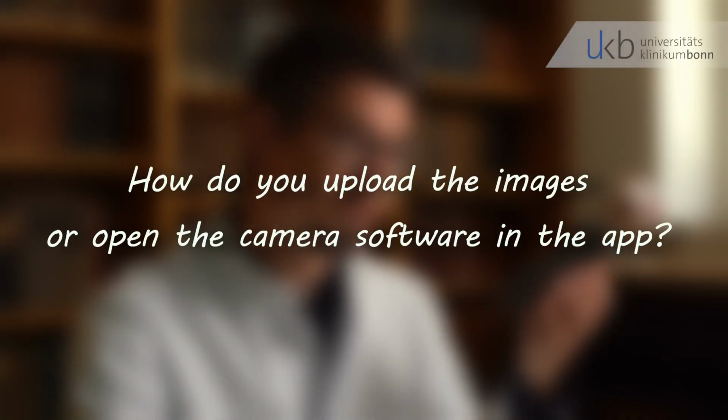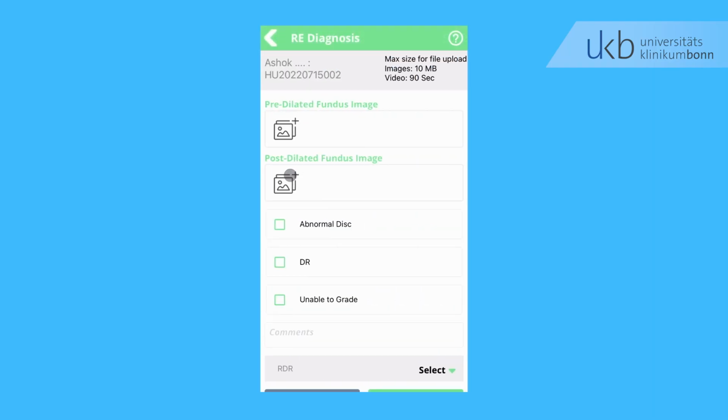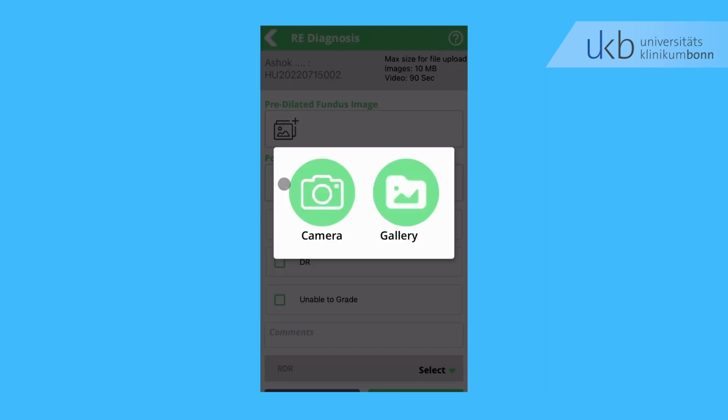How do you upload the images or open the camera software in the app? Go in right or left eye, click on the image symbol under Post-Dilated Fundus Image. Then you have the option to acquire images using the app's camera software or to upload images from your smartphone gallery.